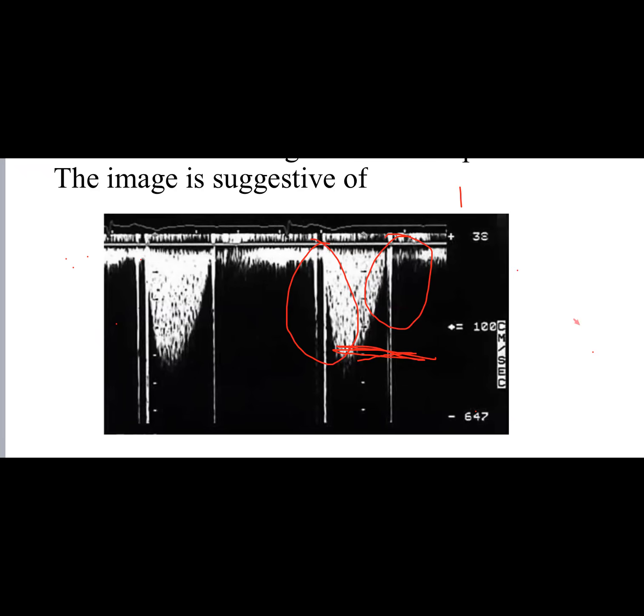So if you see this duplication of the metallic flap in the closure or opening, it may indicate a stuck valve. Of course, along with the gradient, I already have a high gradient. So this is an additional feature, of course. Okay? So remember this one. Good?